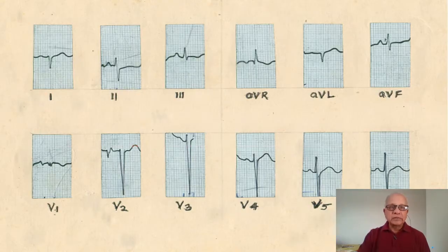So this is the ECG of a 60-year-old male chronic smoker who was admitted with dyspnea of 1 week duration and had an oxygen saturation of 88%. Now the questions are simple. What are the findings which you see in the ECG? What is the QRS axis of this patient? And what probable diagnosis is causing his dyspnea and desaturation?